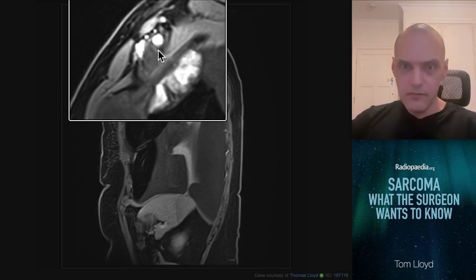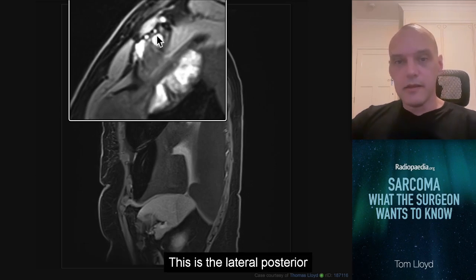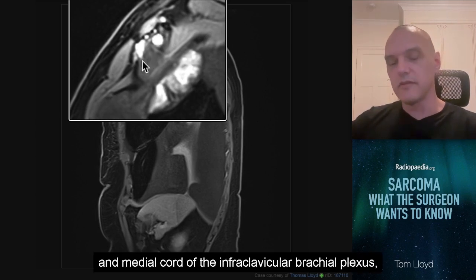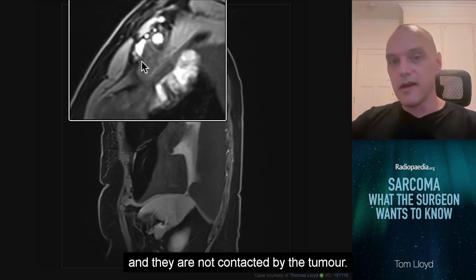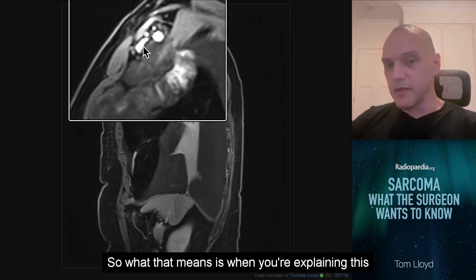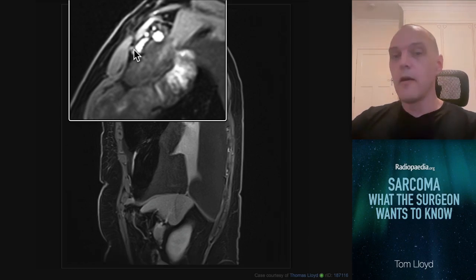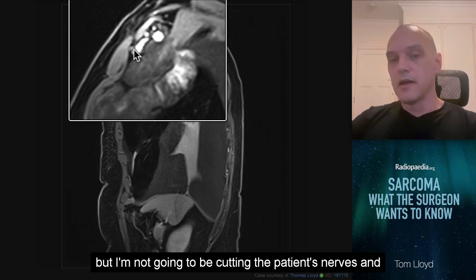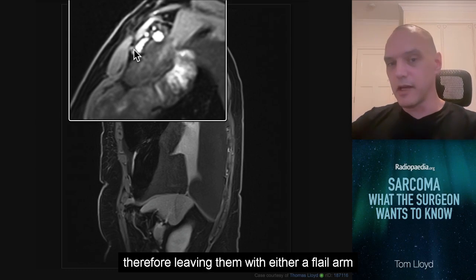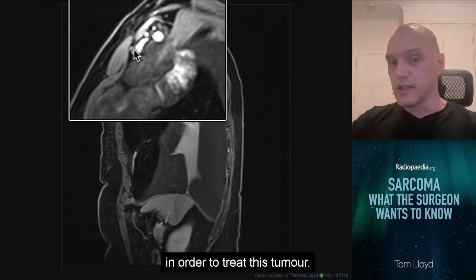circumference. But importantly, and you can make them out here, this is the lateral, posterior, and medial cord of the infraclavicular brachial plexus, and they are not contacted by the tumour. So what that means is when you're explaining this to the surgeon, they're able to think, okay, well, I might need a vascular reconstruction, but I'm not going to be cutting the patient's nerves and therefore leaving them with either a flail arm or needing a forequarter amputation in order to treat this tumour.